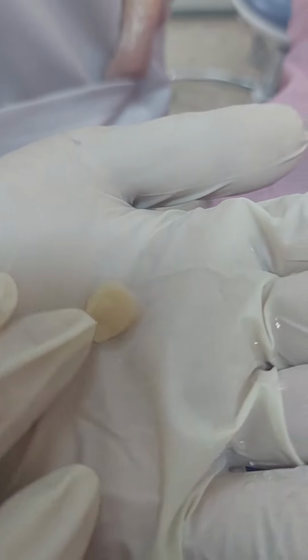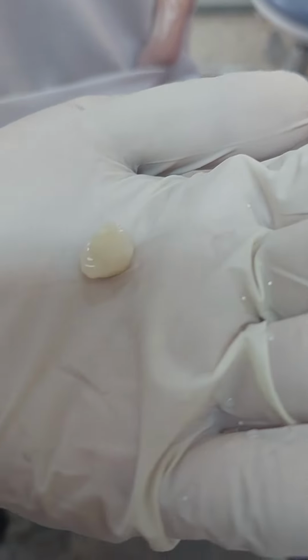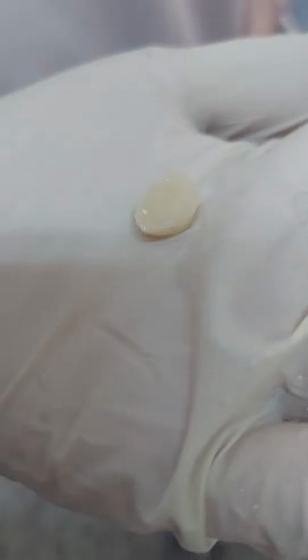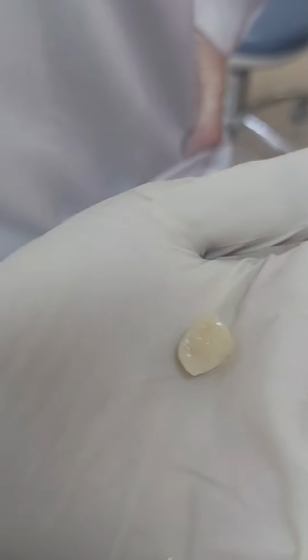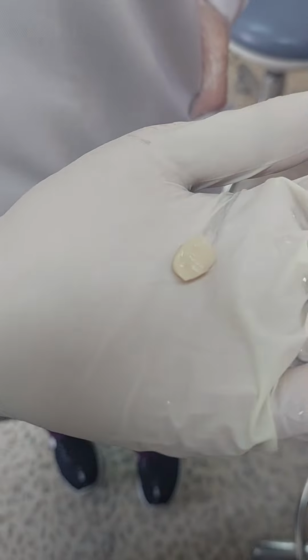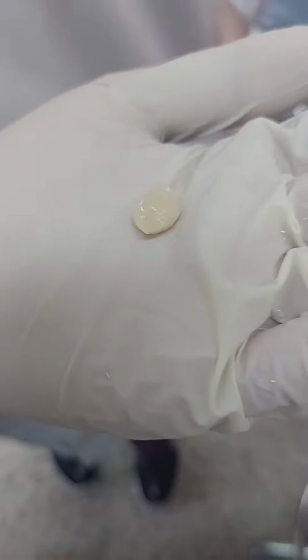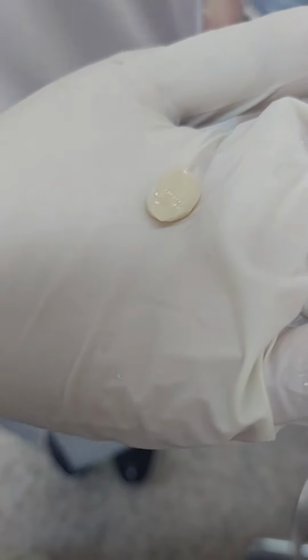Where is the tooth prepared? Only the tips of the tooth are showing. That means you didn't seat it into place. And this sometimes happens when we have multiple teeth around the abutment and the student incorrectly places the index far away from the tooth prepared. So it's either not over the tooth or you have not done any seating.